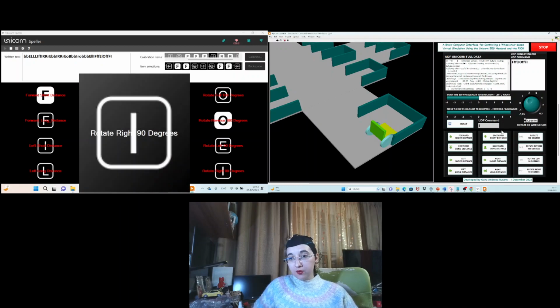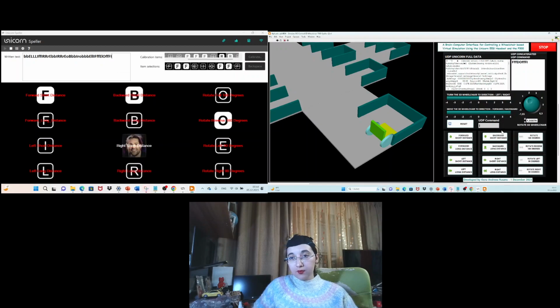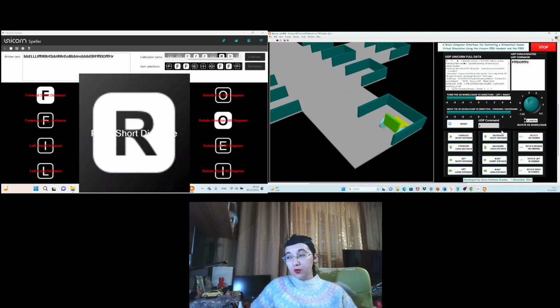Yes, the command was correctly detected. Right short distance. Okay, the command was correctly executed.